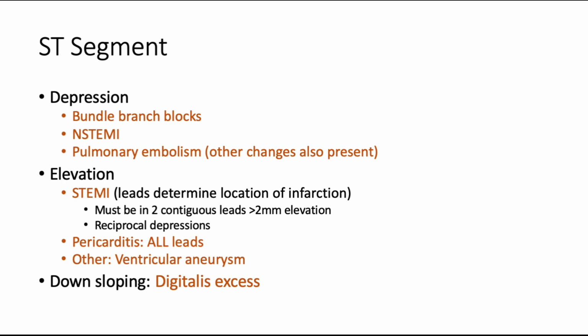So if you see ST segment elevations, there should be other leads where you're seeing ST segment depressions. Now, if you're seeing ST segment elevations in every single lead across the board, then you're looking more at pericarditis and not at an infarct in every single one of the vessels. However, some infarcts may be in multiple locations. It's just very, very, very unlikely. And that's where you can look to other clinical criteria for pericarditis to make sure that that's your top differential.